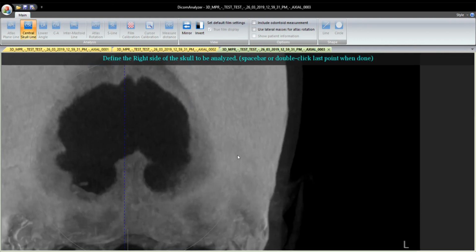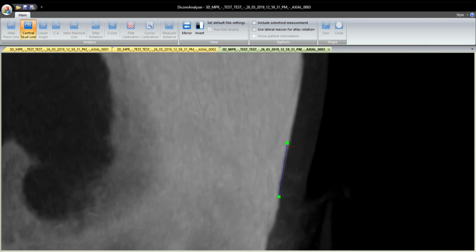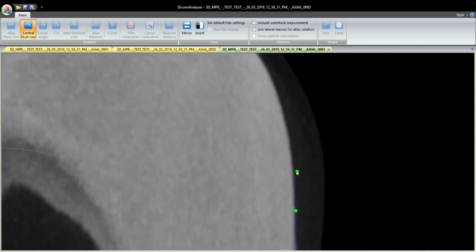And we carry over here, and we do the same thing on the opposite side. And this is really the part where you want to be careful and do it properly. Here's where if we had a little bit higher quality of image in terms of pixel density, it would be a little cleaner. And you get that generally off of the full DICOMs. But this should get us right in the ballpark of what we want to see.